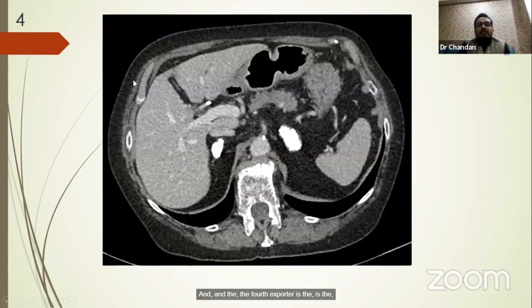The fourth spotter is a contrast axial CT abdomen showing a punctate area and chunky calcification in the region of the bilateral adrenal glands, and the rest of the liver, spleen and other visualized organs appear normal. The chunky, coarse calcification indicates the benign nature of the disease. India is a very endemic zone of tuberculosis, so this is a case of a chronic granulomatous disease, likely tuberculosis.